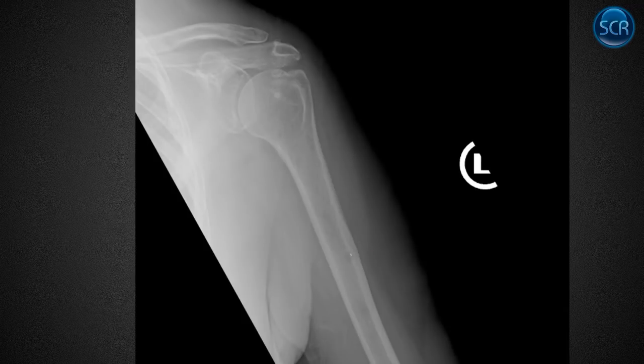All right, so what are we seeing in this one? This one is a case of multiple myeloma. Look at this punched out lesion. Another punched out lesion there. Another one there maybe. That's probably some calcific tendinosis in their infraspinatus or subscapularis. They've got a little irregularity up here, maybe degenerative, not a big deal. Distal clavicle doesn't look great, maybe old AC joint injury.